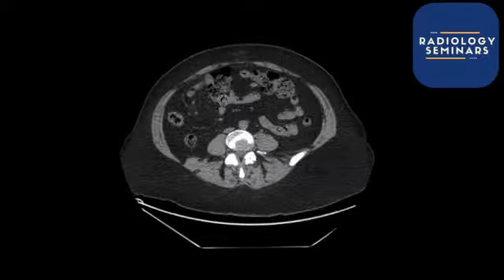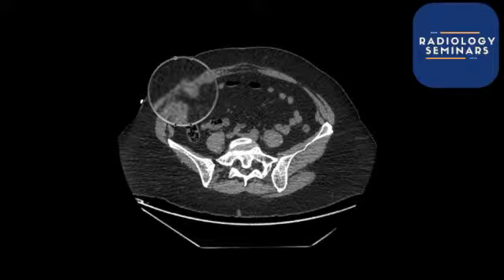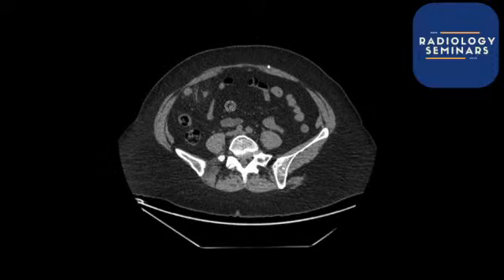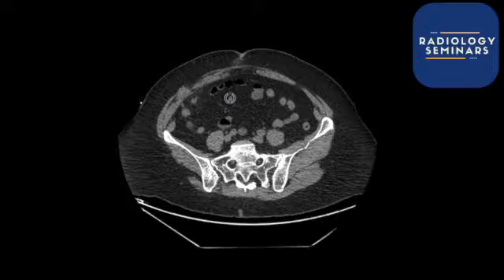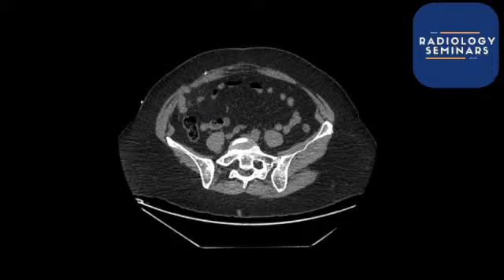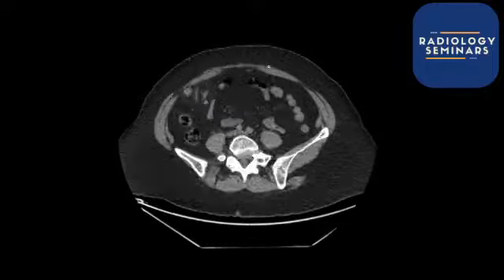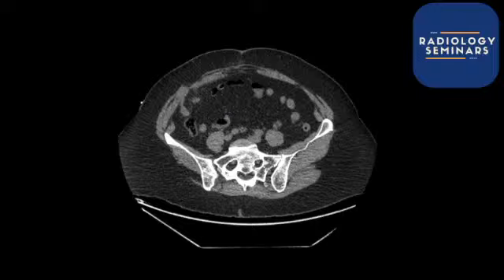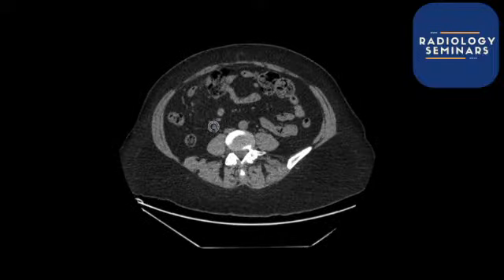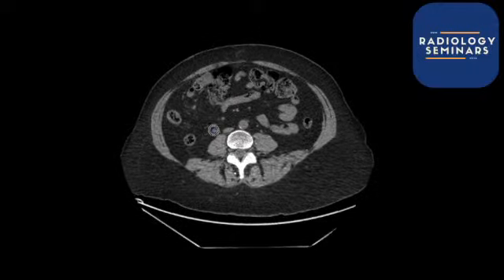Now those of you might be wondering, so hang on, what about this hernia? They clearly had some surgery in the past, because you can see a clip there, and a further few clips sitting over here. So they clearly had previous surgery, most likely a hernia repair, and this is not the cause of the trouble. The cause of the trouble is this very dilated, enlarged appearance to the appendix, and therefore this would be consistent with appendicitis. Important negatives would be that this patient has not got a perforation, they have not got a collection. This would be in keeping with a developing appendicitis.